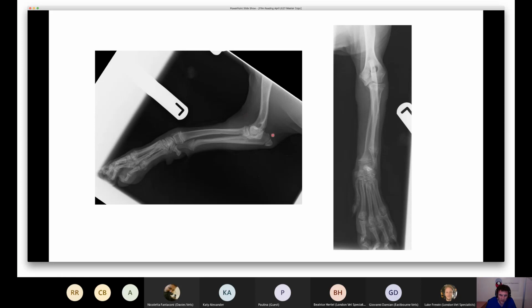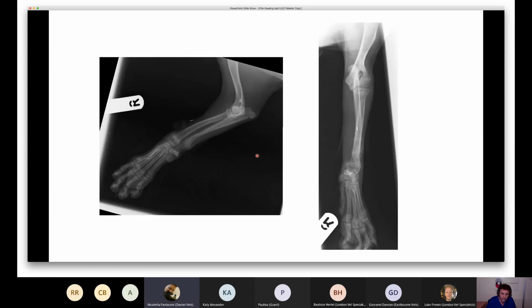You can sort of see it on the left here, but it's more convincingly part of the distal humeral physis. Yeah, I wasn't concerned on the left. I was more concerned on the right. But then I thought you cannot have a double condition. Yeah.